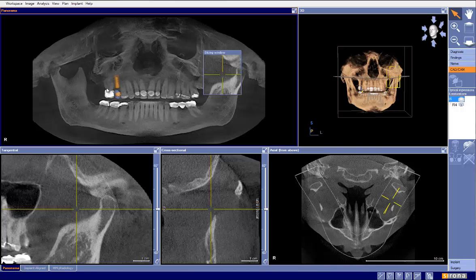We cannot use tooth number 3, tooth number 7, 8, 9, 10, and maybe tooth number 13 can't be used for integration in terms of getting the OptiGuide, but we do have still several other teeth that can be used, and that's what was done here. So let's go ahead and move forward.